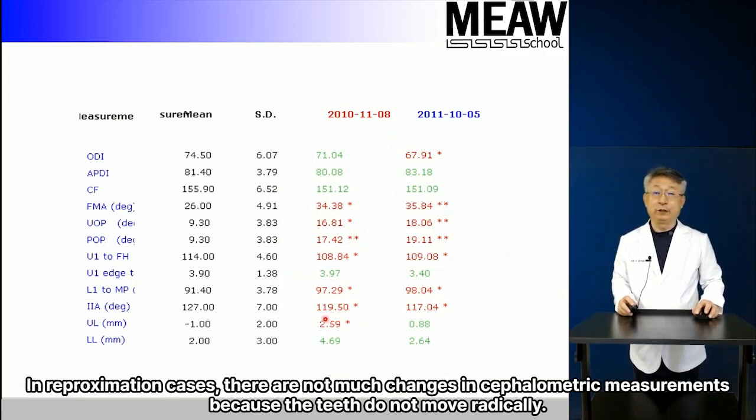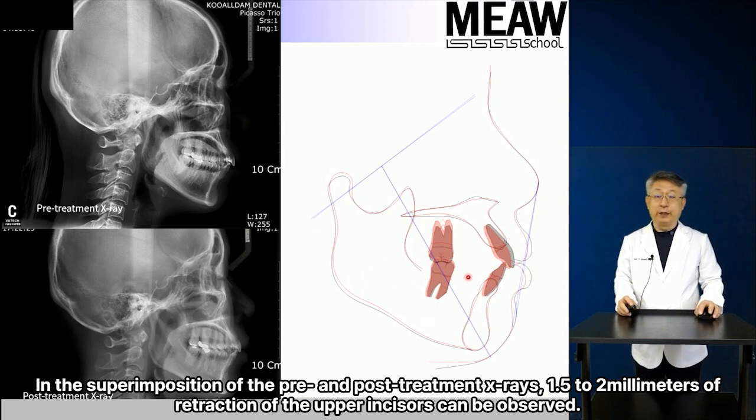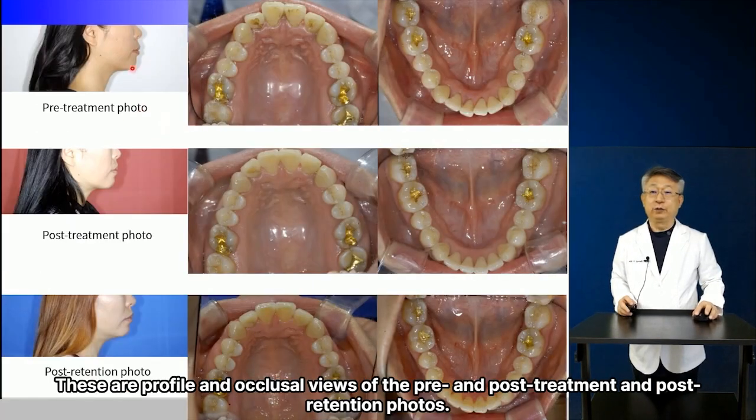In reproximation cases, there are not much changes in cephalometric measurements because the teeth do not move radically. In the superimposition of the pre- and post-treatment X-rays, 1.5 to 2 millimeters of retraction of the upper incisors can be observed. In post-retention photos after 44 months, the occlusion is stable and periodontal health is maintained. These are profile and occlusal views of the pre- and post-treatment and post-retention photos.